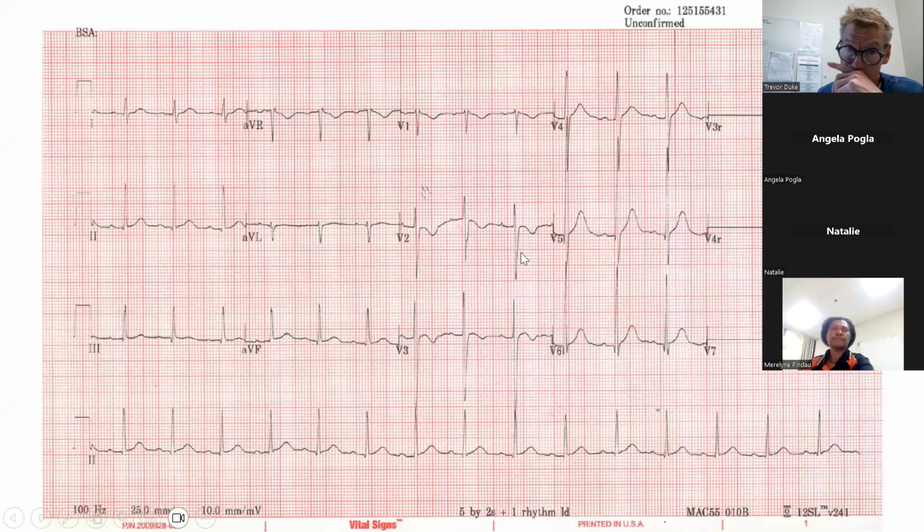So we're up to about 40 millimeters. So it looks like there's left ventricular hypertrophy, but no right ventricular hypertrophy. So really all we found in this ECG: it's in sinus rhythm. The rate's a bit less than 100, probably 90. It's a normal PR interval. There's no evidence of atrial hypertrophy, but there is evidence of left ventricular hypertrophy. So that's all you could say from this ECG.